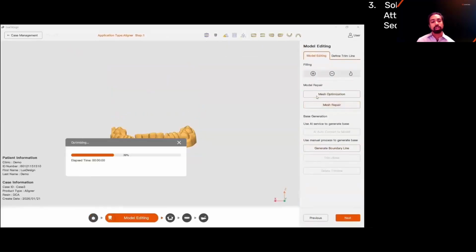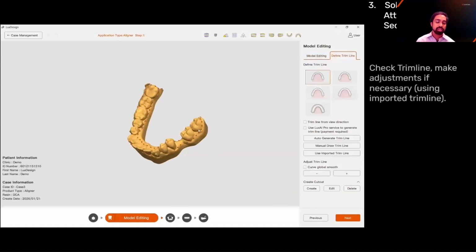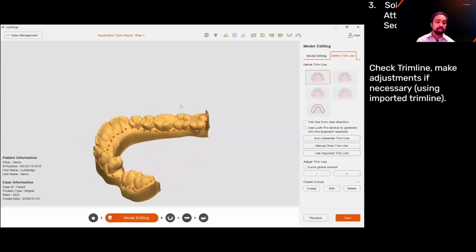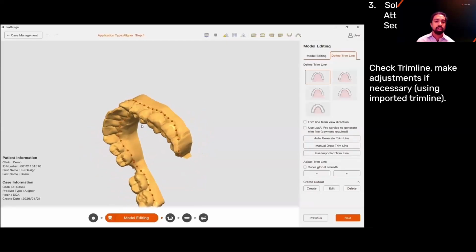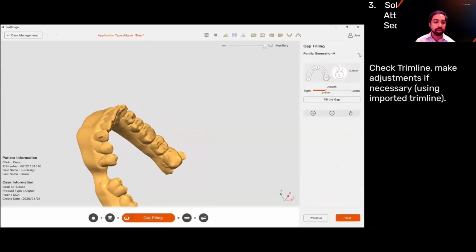And then I'm going to start with lower, just so I can show you the Pontic. This is where you have your Pontic. So this case came preloaded with a trim path, but I made a few modifications to the trim path just to make it a little bit nicer. And so we're going to use that trim path that I modified for subsequent, and we'll show you that.